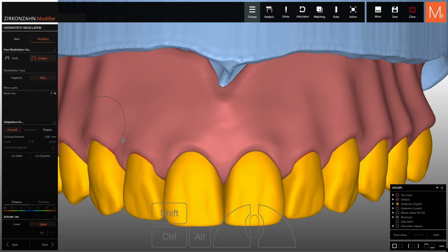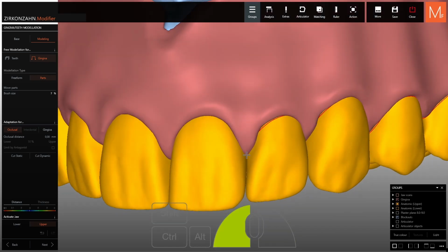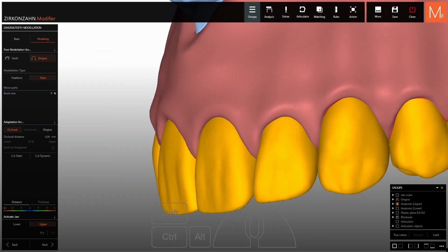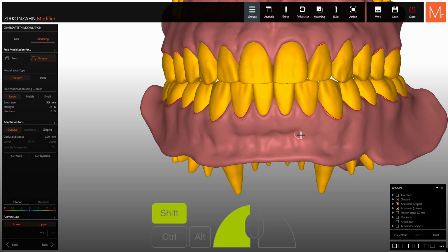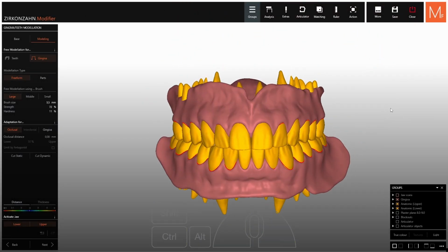Now, since I respect your time, I will make a cut for the following free modeling sequence. This took me roughly 25 minutes. I've maybe exaggerated a little bit and could have also done it in 5, but I like to do it and no one can stop me.